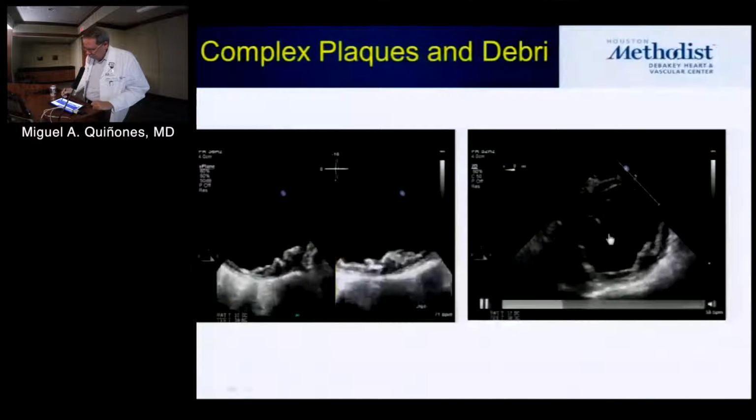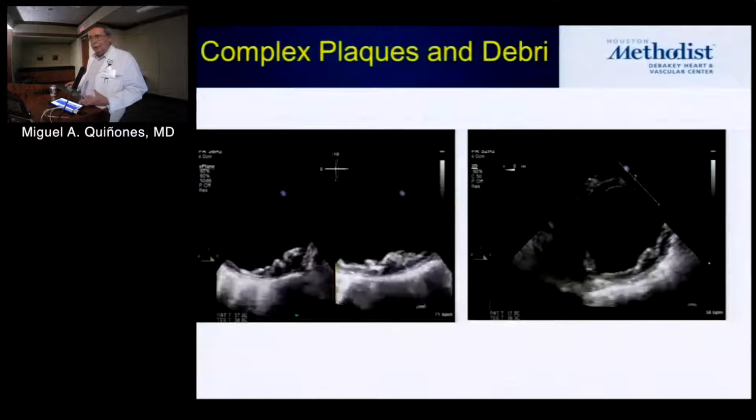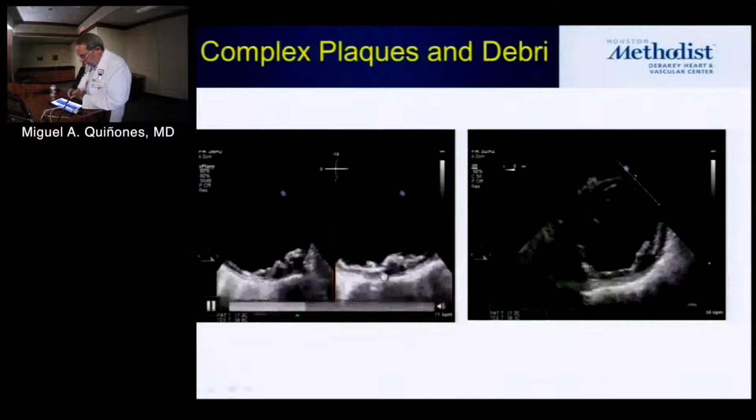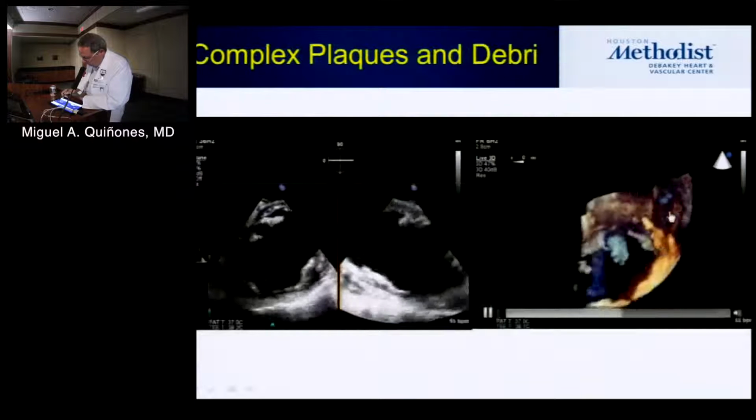These are just more examples, so you can see all the different variations that you can see. Not uncommonly, these people are in their late 70s, 80s, but we have seen a few in their late 50s and early 60s with this. So it all depends on how bad your genes and your atherosclerosis and your aorta have been. This is basically atherosclerosis, disease of the aorta. The question is, what are the flying objects? Okay, this is another 3D of this particular one here. You can see it there nicely.